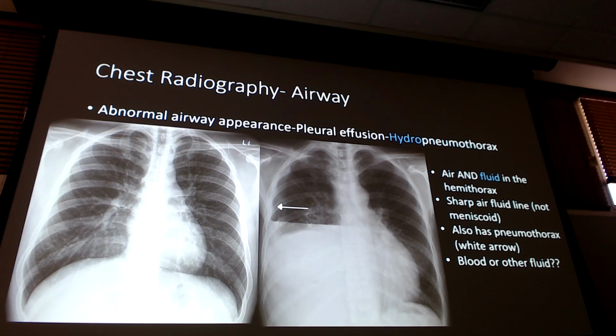We will stop there. I will stay up here for any questions, right? Lots of different pleural effusions. Understand what they are, understand how they move, which ones don't move with a decubitus. So if you get an x-ray of a PA and a decubitus, and the fluid stays the same, you have an idea of which ones it could be versus if it doesn't stay the same, if it kind of moves around. And understand some of the signs of being able to see it. The meniscus sign, that's how I know that could be fluid in there. The pushing of the mediastinal structures and the trachea versus the pulling of the atelectasis. These are the things that will tell you the difference between the two.